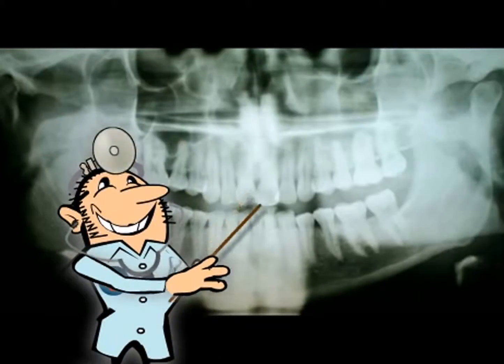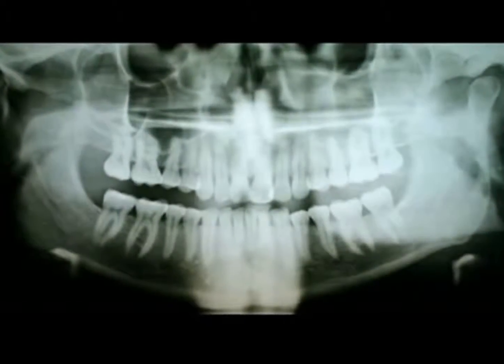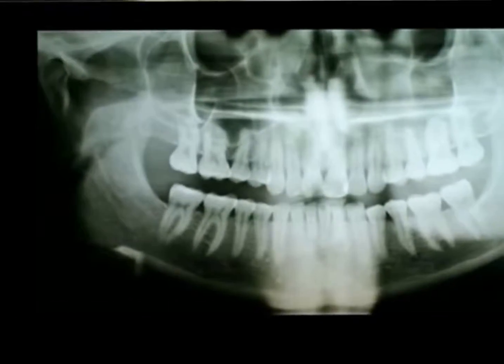An experienced doctor can tell a lot more from a panorama view. The structures described here enable a general overview. The contrast, clarity, and demarcation of the structures in question are also analyzed, not just the structures themselves.